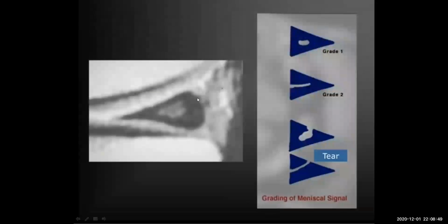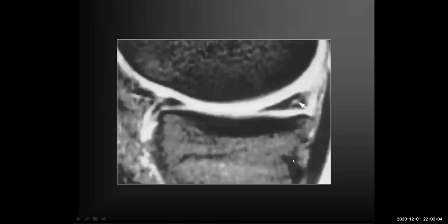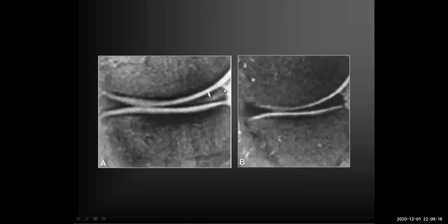It's the meniscus. Okay, this is type 1, this is grade 1, grade 2, and if it is out, then it will be grade 3. This is grade 3 as well. I have more than one slide for the same pathology so as to consolidate. Okay, this is again type 1. You can see it's type 2 extending up to here. It's approaching almost type 3. And this is which type? This is type 2.